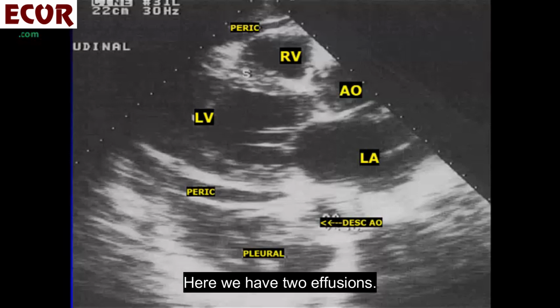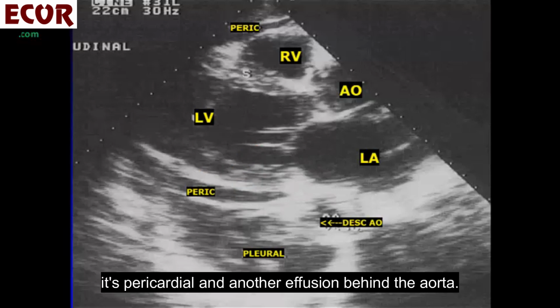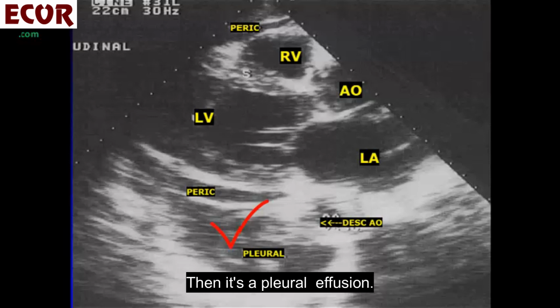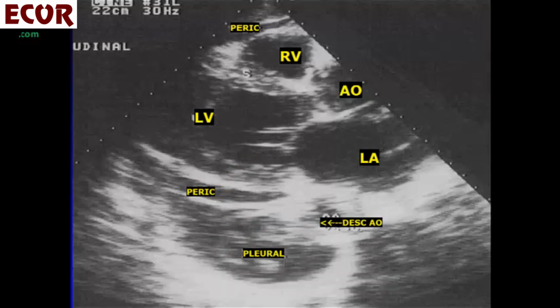Here we have two effusions. One is anterior to the descending aorta, and there is a bit in front of the heart. Then it's pericardial, and another effusion behind the aorta. Then it's a pleural effusion. The pleuropericardial line is between the pericardial and the pleural effusion.